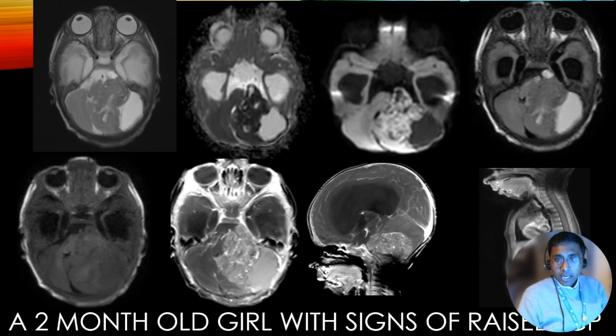So moving on to another embryonal tumor. This is a 2-month-old girl. Always look at the age of presentation of these pediatric brain neoplasms. So this was a 2-month-old girl with signs of raised intracranial pressure. What we see here is a very heterogeneous mass in the posterior fossa. As you can see, it is slightly off midline towards the left side, and it is showing diffusion restriction, at least in a solid component.